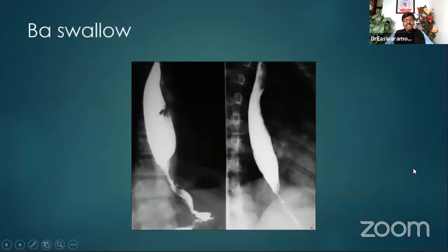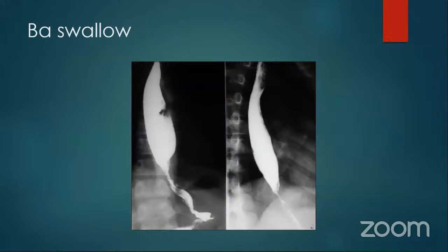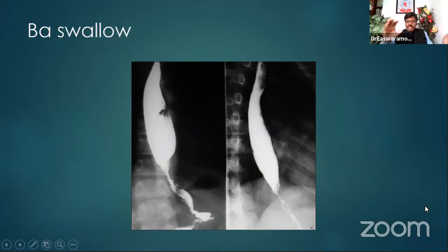So the next patient is an elderly man presenting with dysphagia for solids, weight loss, and he is now finding it even difficult to swallow his own saliva. Gradually, it got worse and worse. Karthikeyan, what do you think this could be? Sir, carcinoma esophagus, rat tail appearance. Yes, you have to tell the examiner to get it absolutely right.